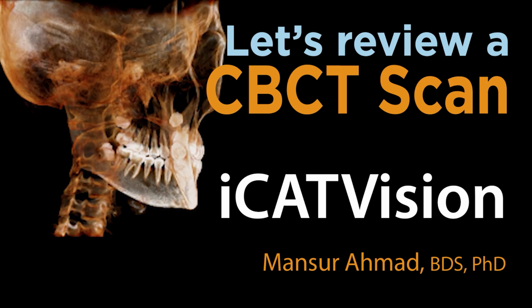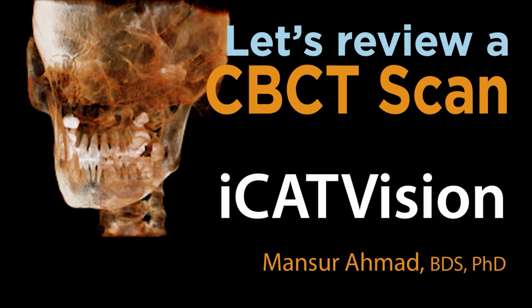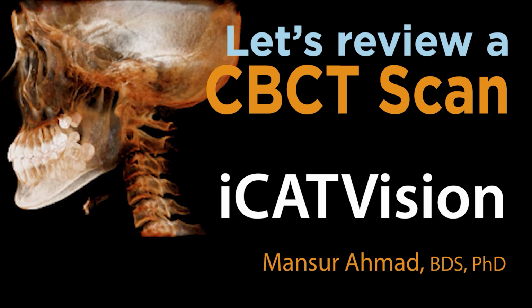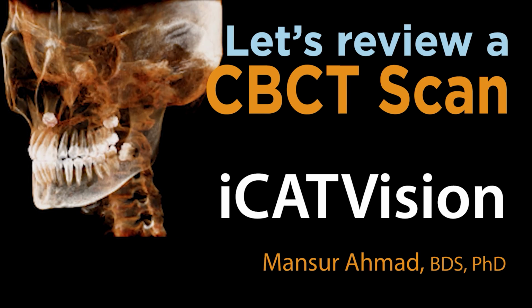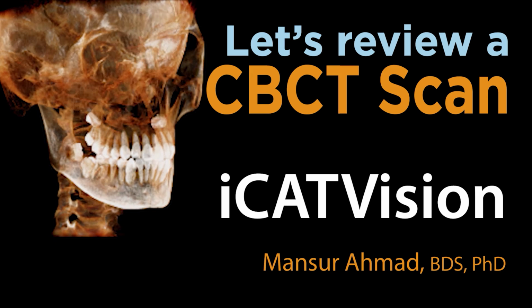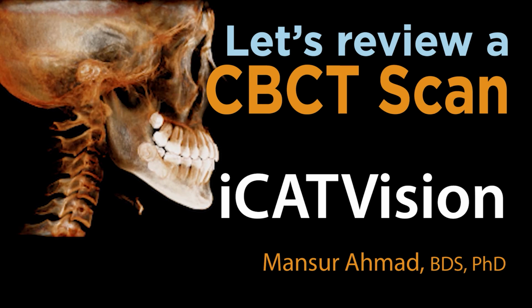In this video, we are going to learn about iCATVision software. This is the default software that comes with iCAT CBCT unit. If you get a CD from the radiology clinic containing CBCT data, the CD will also include iCATVision. This is a free software. Therefore, you may install it on any Windows computer.